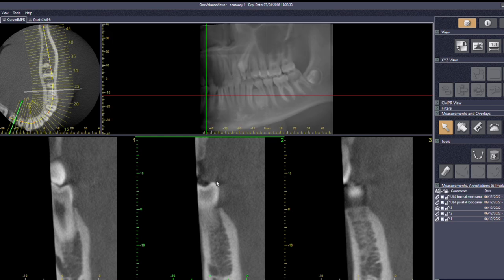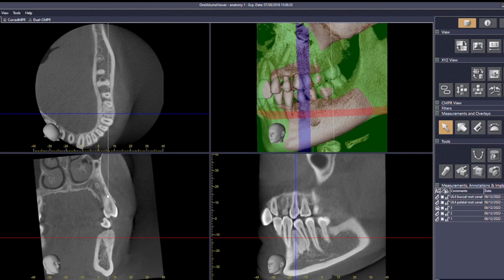We will learn on the masterclass, if you come on it, what these 3 views are. You'll also learn things like drawing the nerve canal, adding an implant, sculpting the volume, rendering, things like that. These are all skills we can teach you on the masterclass. So there's our nice panoramic style view. Here's us looking at pathology in 3 views. Thanks very much.